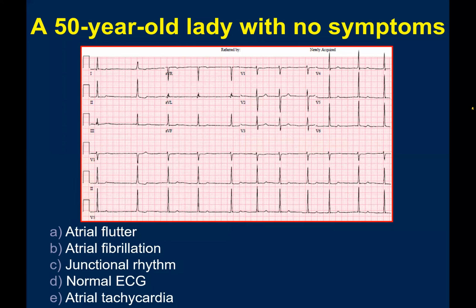Excellent. So in that case, it's a very common ECG. Even most of the post-operative AFib is common. So irregular rhythm, narrow QRS complex, no clear P wave, then we are dealing with atrial fibrillation. And atrial fibrillation could be fast initially, but if the patient is on medications or has an AV node problem, the rate may not be fast. How do you calculate the heart rate in atrial fibrillation?